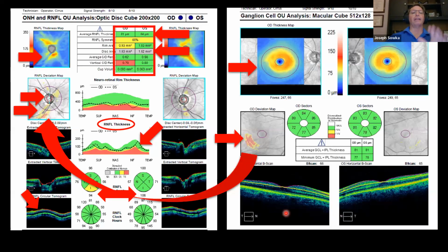Yeah. Yep. This is a fantastic example. I mean, this is good quality imaging. The machine has done its job. Now we have to do our job because there's so much conflicting data here. So much of this abnormal person has fallen into the normative data range.